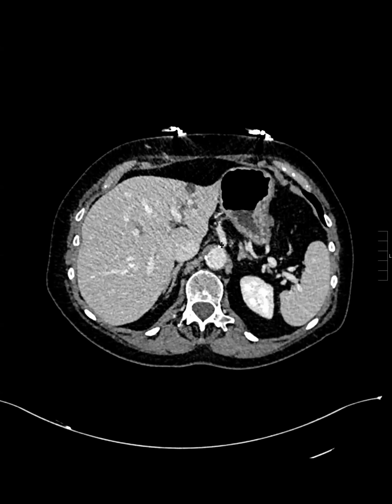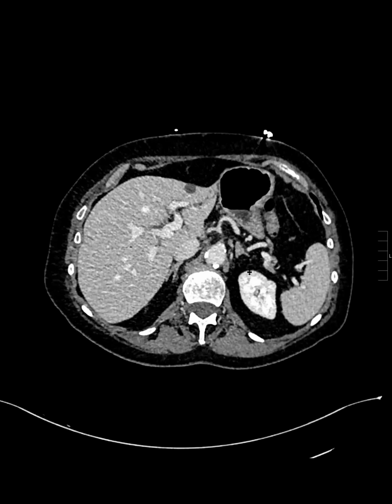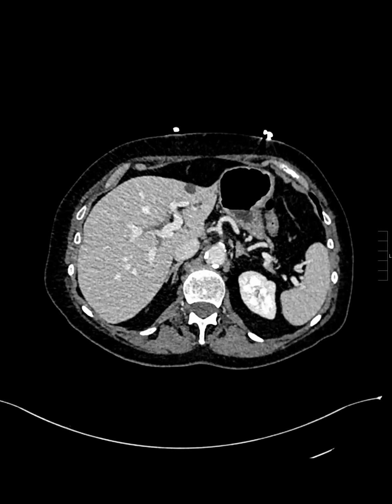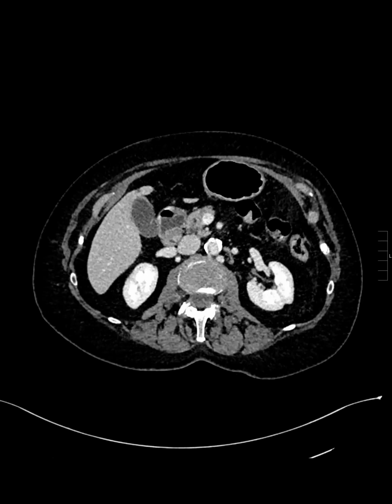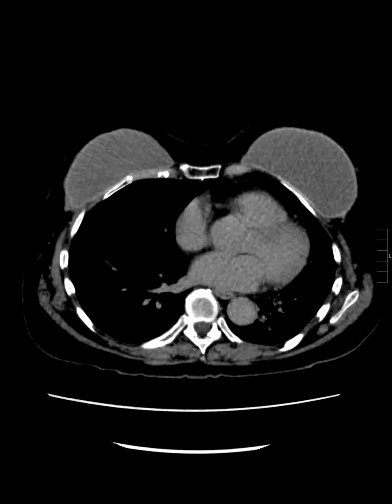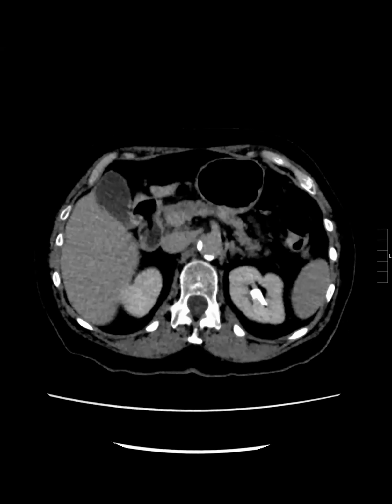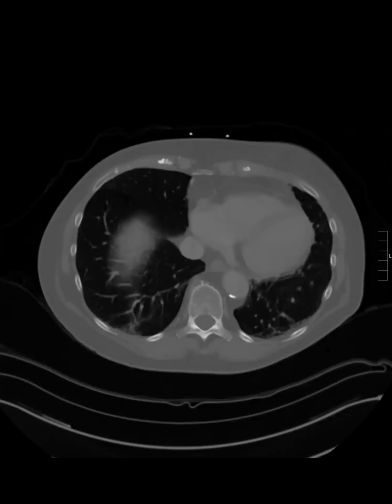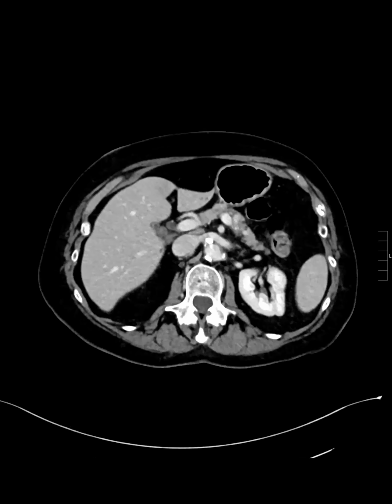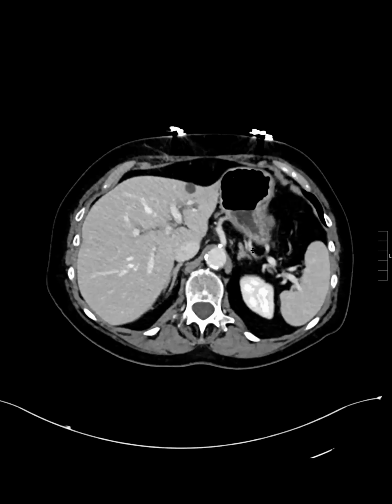There's a little bit of segmental biliary dilatation, and a few what look like cysts in segment 3. This was new compared to a CT that we had a few years prior. So what do you guys think about that? Is there any lesion at the apex of that biliary dilatation? Not anything that's conspicuous on CT.